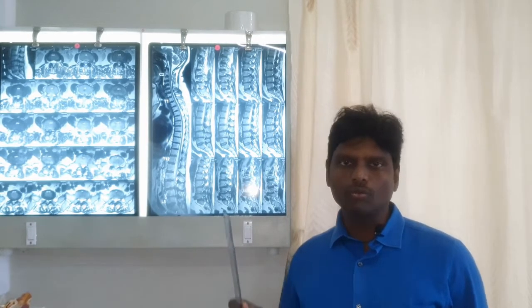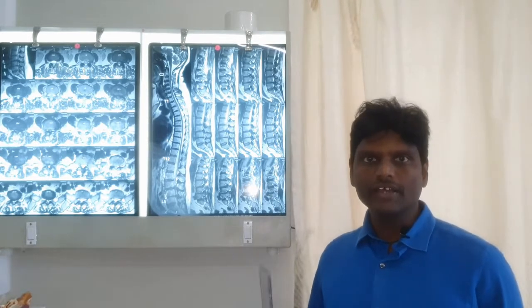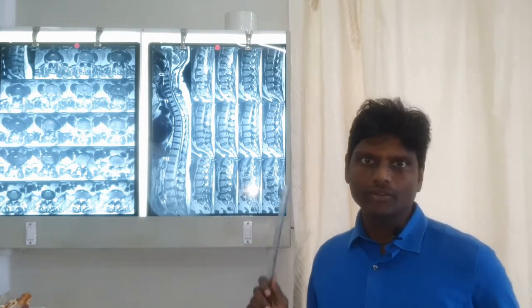She could not walk more than 10 to 15 steps at a stretch, and she could not stand more than a couple of minutes. So that's her present scenario. She finally went for an MRI, and this is what the MRI looks like. I'm going to go through the list of things which I see in this MRI that will help us understand the nature of the pain she is suffering from and what should technically be done to get rid of her pain.